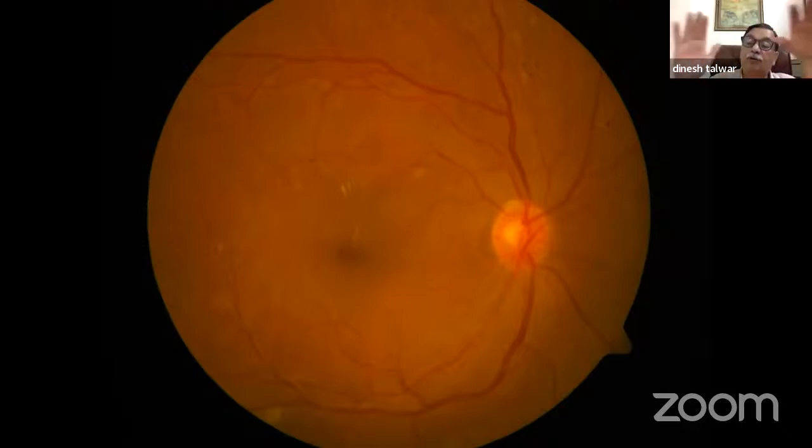Okay, so we are not going into that level. First thing is, from this level, what do you get? So it's non-proliferative diabetic. It is not proliferative. It's not just diabetic retinopathy, it is non-proliferative diabetic retinopathy. Yes, sir, definitely this picture is non-proliferative diabetic. If there's a proliferative change somewhere else, we don't know.